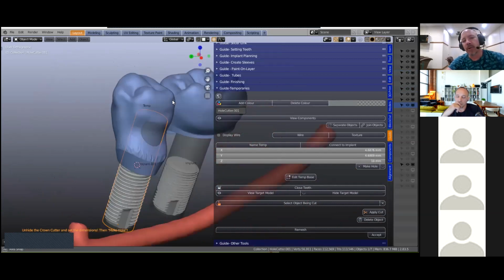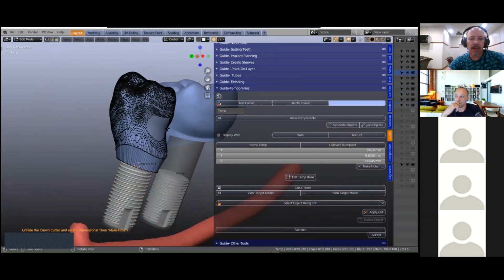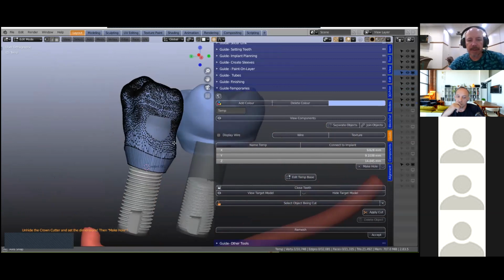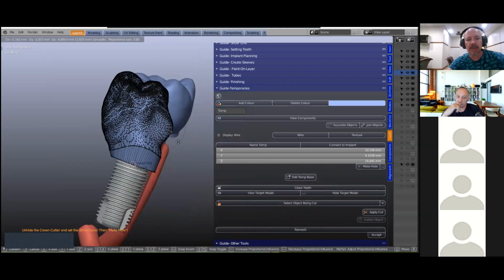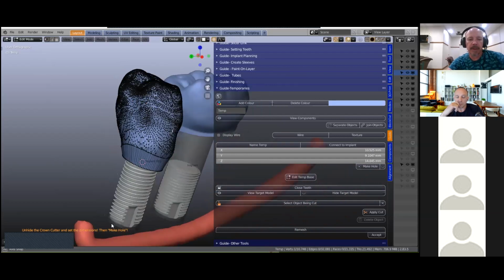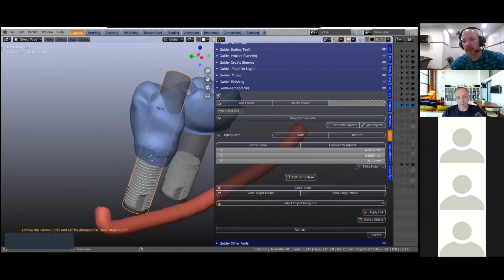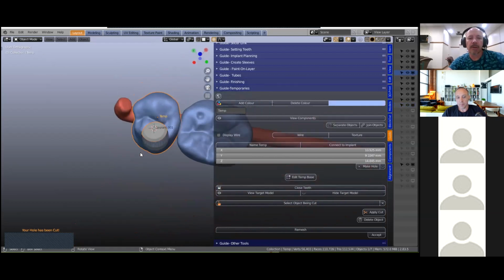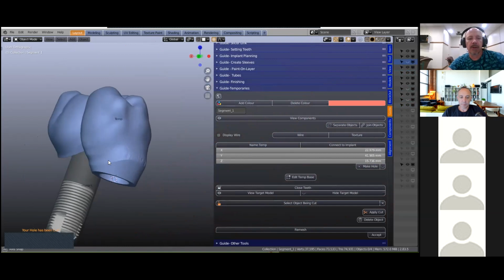As I said before, we could have maybe used an angle here, but I would then probably just grab this mesh and pull it out a bit so that we can actually make a hole going through it. So let's grab this, put it through like that, and then click on make hole. That's made a hole through our little unit there. And then of course if you wanted to print that, away you go.